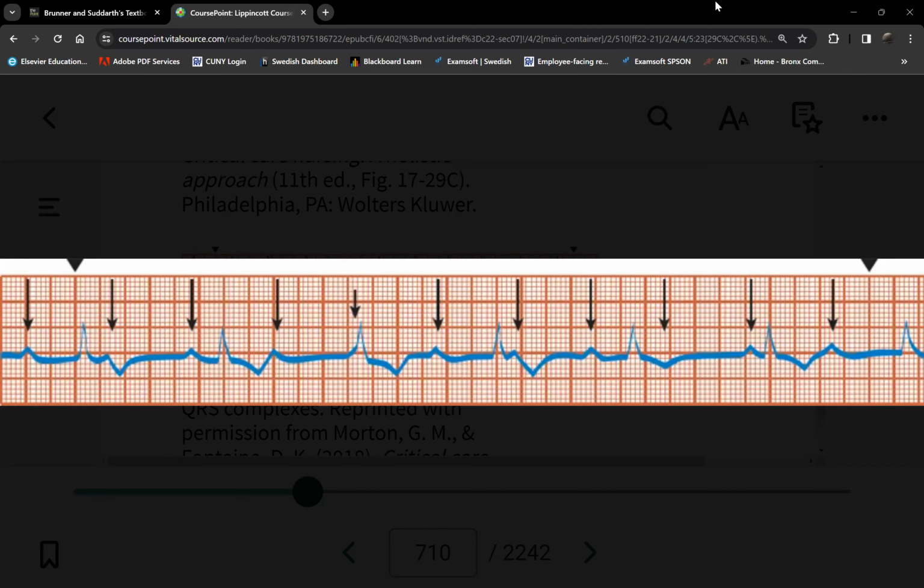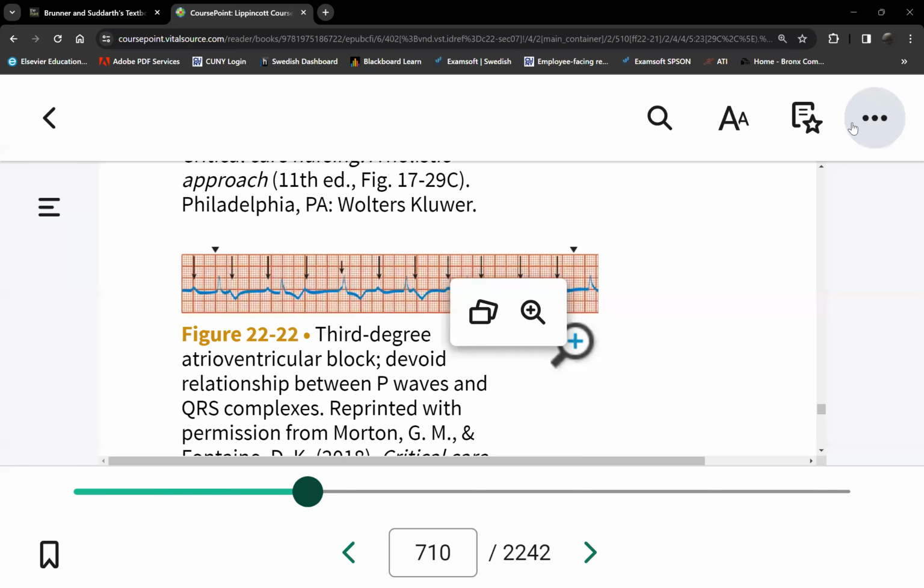As you can see, the evidence is there's a different atrial rate. There's also a different ventricular rate. Both are regular. So regular atrial rate, there's also a regular ventricular rate. So therefore, are we talking to each other? I'm the SA node, she's the AV node. Are we talking to each other? No. So this is what we call a complete heart block. So third degree heart blocks are complete heart blocks.